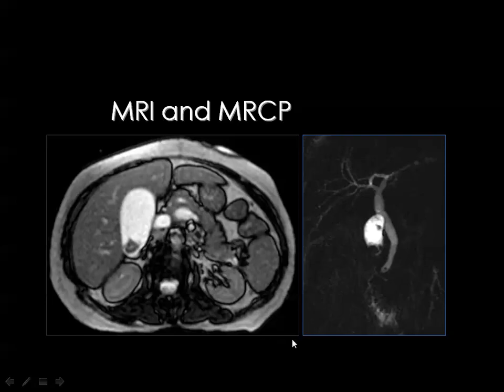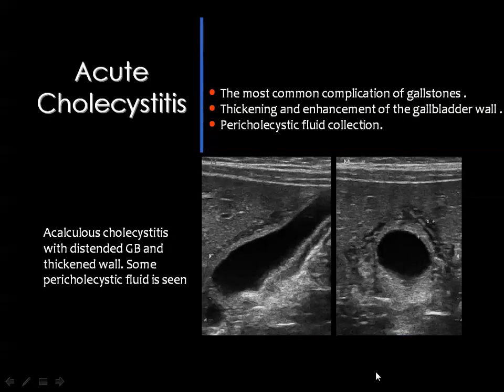This is the appearance of gallstones by MRI. This is the gallbladder, which is distended by hyperintense fluid, and this is the low signal stone inside. And these are the major advantages of MRCP in diagnosis of gallbladder and bile duct lesions. You see this is an MRCP showing the intrahepatic biliary radicals, the common bile duct containing a small calculus. Also, the gallbladder contains multiple variable sized calculi.